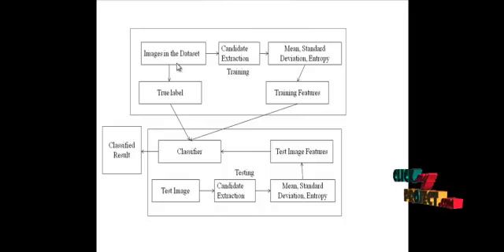Let me see the flow of the process detection of abnormalities in retinal images. Initially, the test images are taken and the green channel is extracted from the images. The green channel extracted from the retinal image contains useful information related to the defects. Then pre-processing is applied. In pre-processing, illumination equalization and contrast equalization are done in addition to the filtering process. In illumination equalization, the defects in the images due to changes in lighting conditions are corrected, and in contrast equalization, the defects due to contrast variations are corrected.